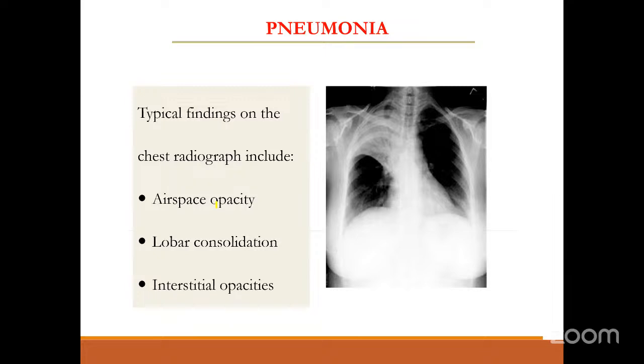So that leads to an airspace opacity. Based on the airspace opacity, its location, where it is, upper zone, middle zone, lower zone, only one side, right or left, and based on the pattern of involvement, whether it is patchy or diffuse, we come to a clinical diagnosis.